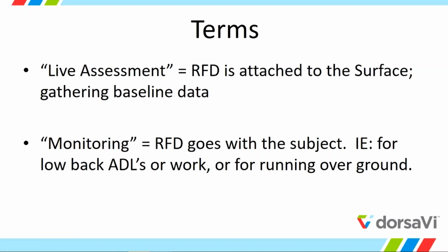Okay, just a few terms. Sometimes people get this confused initially, but live assessment is when we're collecting baseline data for the low back, and it's always referring to a test where the RFD is attached to the surface. Monitoring, on the other hand, is when the RFD goes with the subject. So we have a monitoring application for low back, so you can send the subject out to work and throughout their day to monitor their positioning throughout the day. And we also have one for running, so when people can go run over ground.